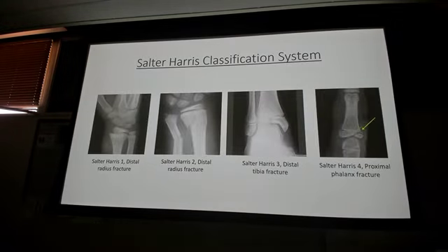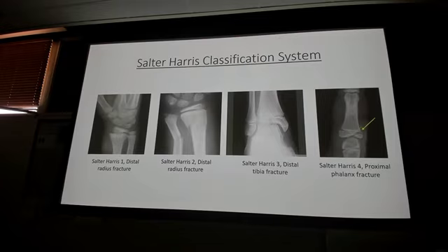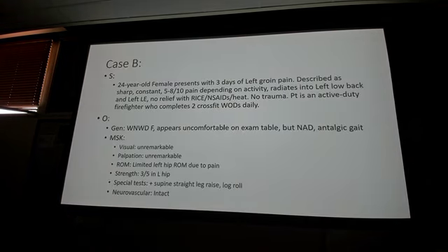All right. And then in these slideshows, I have a quick review for you of the other Salter-Harrises. So if you're using this to study and test yourself, it's right there. Double check, remind yourself which of the Salter-Harrises are what, right? And remember, it can be tiny, right? Look at that Salter-Harris 4. Look at that small little fragment, that makes it a 4. That is a fracture of metaphysis as well. If I give you multiple images, I'm giving it to you for a reason. Okay. So now let's shift.